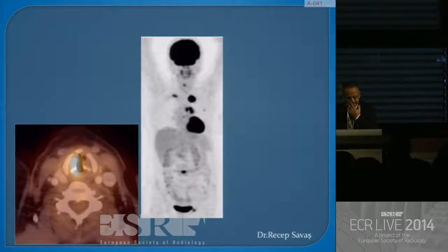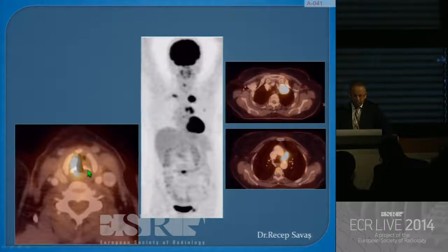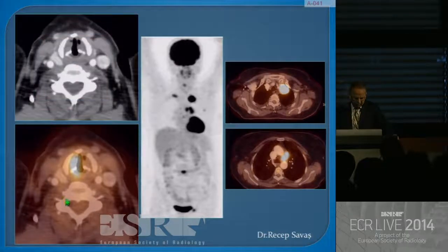On these PET CT images, the right vocal cord looks bright, but the left doesn't. This is a result of paralysis because of a tumor in the thorax, paralysis of the recurrent laryngeal nerve that causes this dissimilarity. So the CT slices can guide us to a conclusion of paralysis.